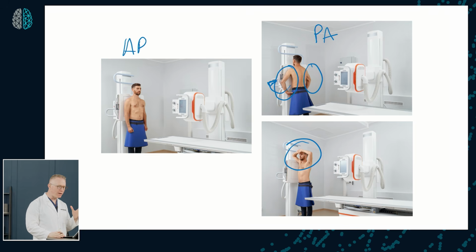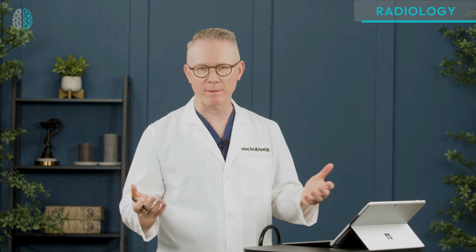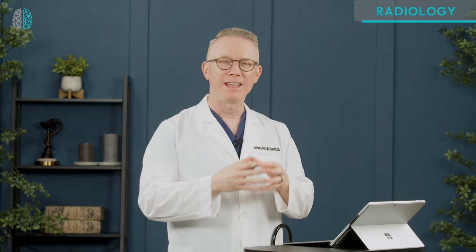Okay, so this has all been about projection, AP versus PA, and knowing how it was acquired and considering how that patient is positioned in the bed. So when we think about the purpose of this topic, we need to put it in the context of other things that we learn. I teach the RIPE mnemonic, R-I-P-E. This is used, not just by me, but other people as well, to help us to ascertain and discern if the image that we're looking at is of appropriate quality.